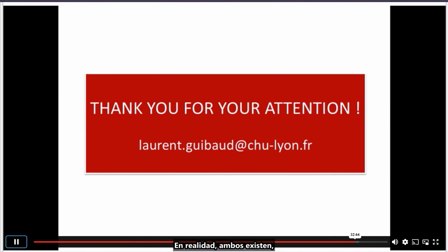In fact, you can have both exist, but this is capillary telangiectasia and not DVA. DVA is developmental venous anomalies, but in that case, you have true capillary in the malformation. You can have association of DVA and capillary telangiectasia, but with DVA, you don't have this kind of images.